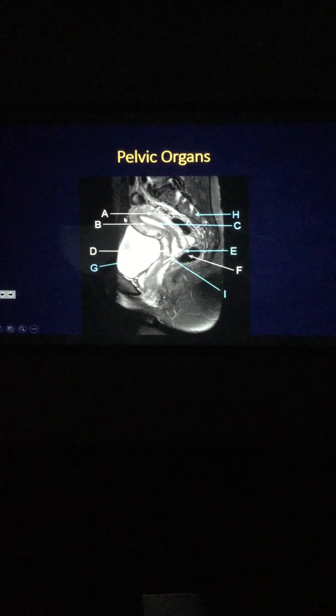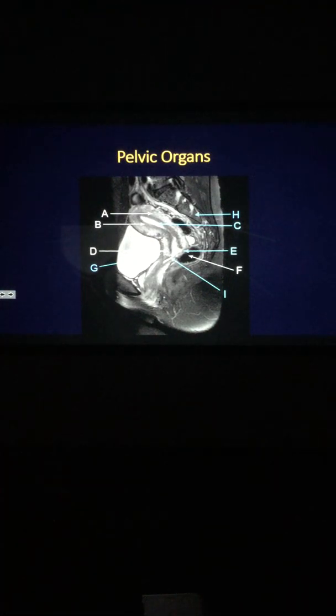But if you want to know much more detail, and you're not only interested in the uterus but in the surrounding parts of it, what is happening to the urinary bladder, what is happening to the pouch of Douglas, what is happening to the rectum, all kinds of things can be seen by MRI, magnetic resonance imaging. As MRI does not use radiation, you can safely use it in younger ladies without irradiating the ovaries. Here you can see the anatomy of the uterus.